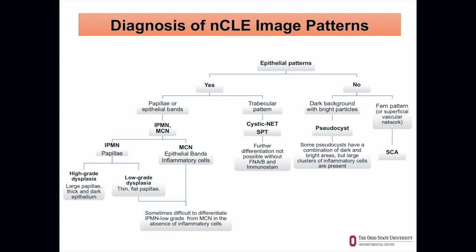Now, it's sometimes challenging to differentiate between MCN and an IPMN with low-grade dysplasia, which has much flatter epithelium, and we will discuss that in the next few slides.